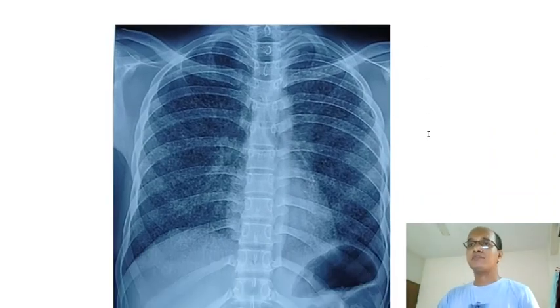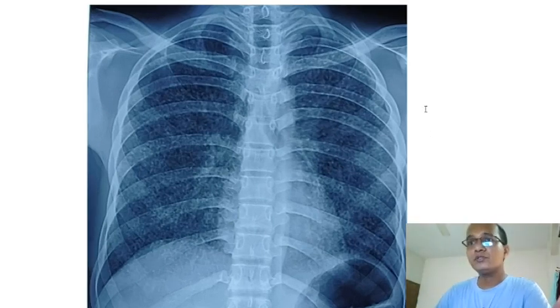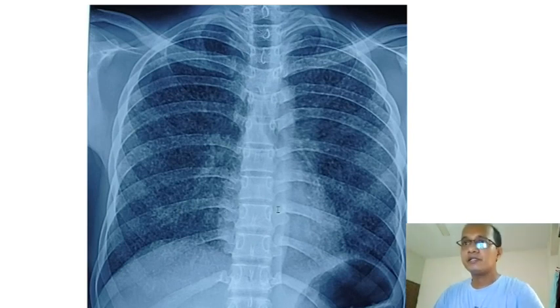The next one is very important. In this case also, pause the video and make your diagnosis within a maximum of 20 seconds. This is also an X-ray chest PA view showing the trachea central in position, cardiac shadow is normal, diaphragm normal with fundal gas shadow on the left side. There is no bony deformity, no soft tissue deformity.